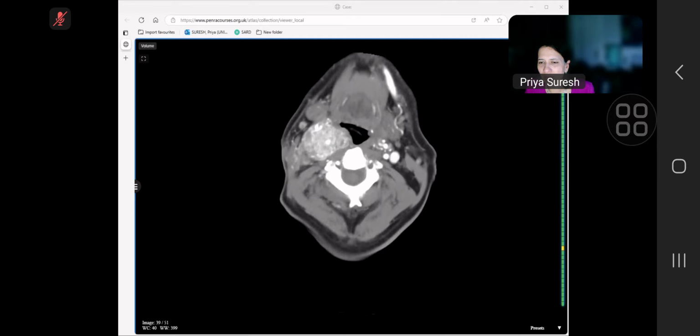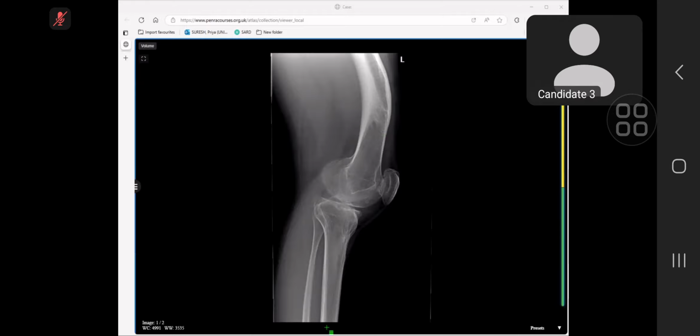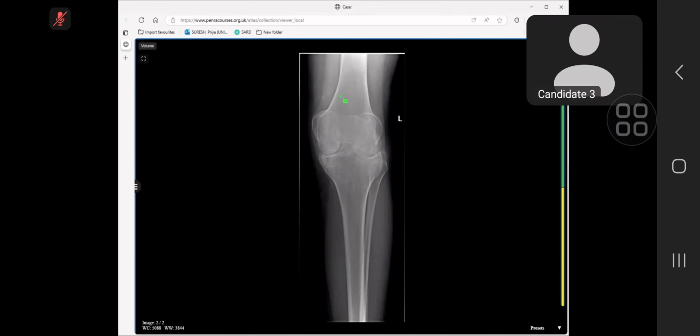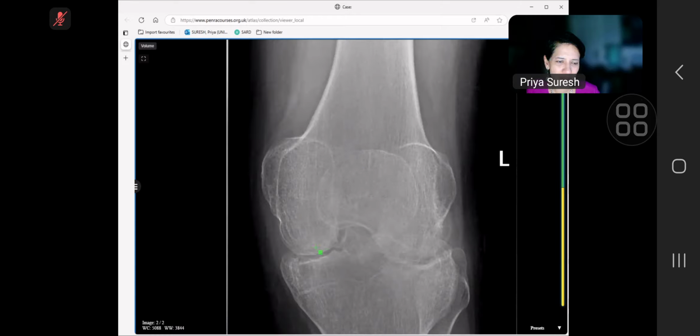The previous one was, so why do you think this is happening? Due to bone softening, maybe. I am not able to figure out. So your main differential, I think, was, I mean, you were sort of getting juvenile rheumatoid arthritis, but you said hemophilia. Yes. So the notch is really big.